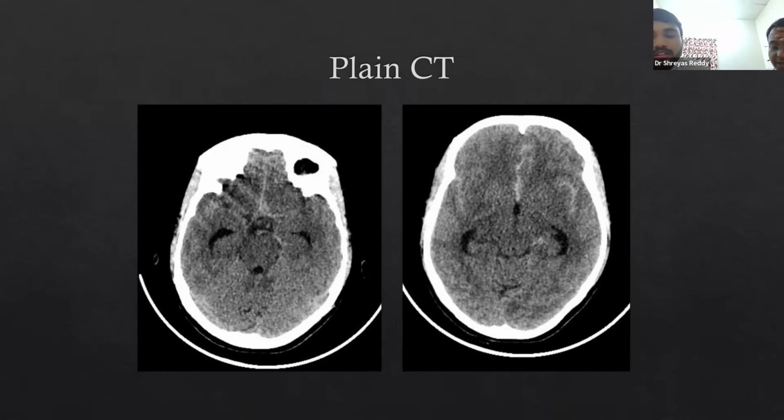Okay. So now a patient has come to you. You are the intervention radiologist who has been called to look at this patient. Now you are seeing the interhemispheric bleed with some bleed in the sylvian fissure. So what is the most probable site of bleed you would suspect in this patient? The site of the SAH usually gives us the clue as to what artery can be involved. So here it is the interhemispheric fissure. So I would think of an ACOM to be the involved artery here. Yeah. So ACOM aneurysms, or distal AC aneurysms, most commonly bleed in this interhemispheric fissure.